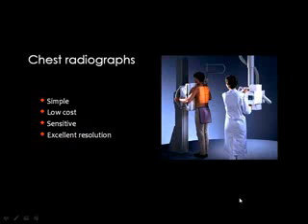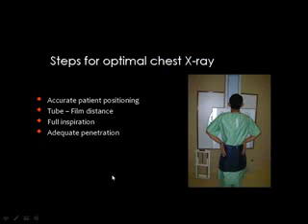Actually, as you all know, the chest X-ray is one of the simple procedures in the radiology department, and is frequently used because of its relatively low cost. Meanwhile, it's very sensitive and provides an excellent resolution. And in order to interpret the chest X-ray, we have to know the criteria of the optimal chest radiograph.